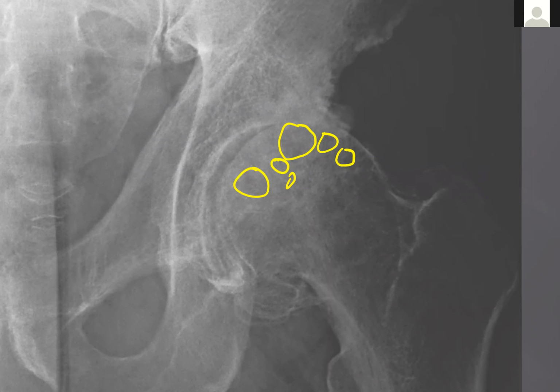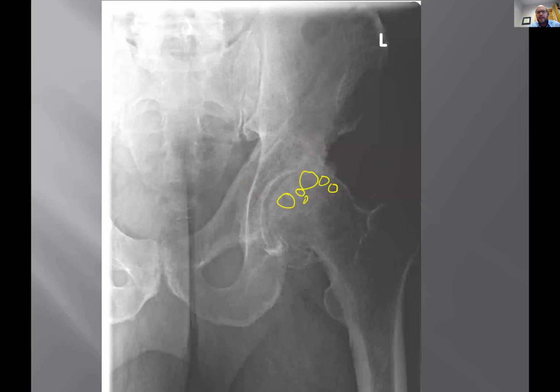Paget's? Did someone say Paget's? Yeah. Okay. Yes, that can cause it. Now, if I had Paget's here, what I would see is more thick cortex all along the edge, and then trabecular striations like this. You can get lucency of the Paget's with the so-called flame sign, but that is typically the blade of grass. It's really pointed. It doesn't cause circular lucencies.